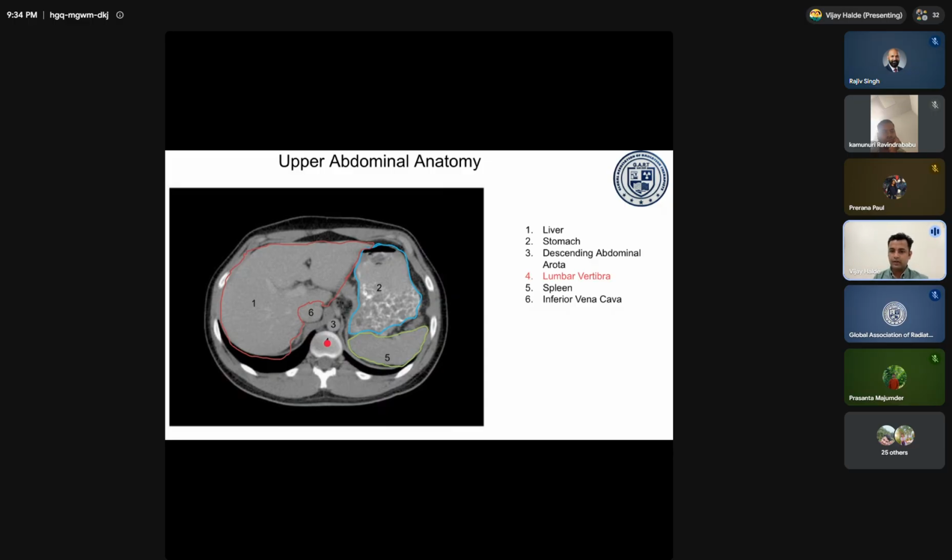After taking the food, our stomach moves laterally, anteriorly, and inferiorly also. So the shape of the stomach will vary from patient to patient. Here we can see the hard portion is lying down posteriorly, semi-solid, and air is at the upper level, because the heavy food will be at the lower section.